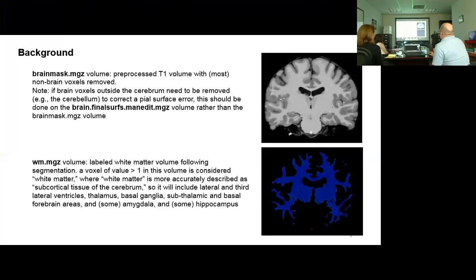And so one concept that will be important as we go forward is this idea of gray-white contrast. So it's how easily distinguishable is the tissue that is white matter, so this tissue here, from the gray matter, this tissue here. So right here, this boundary is pretty distinct.